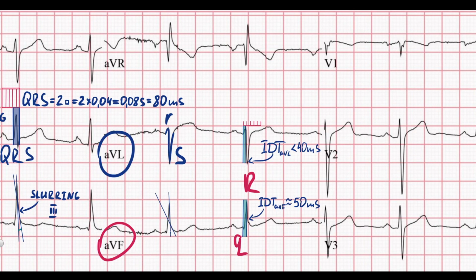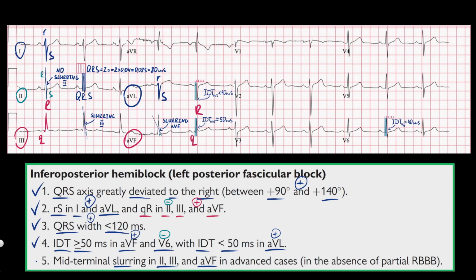The same we see in AVF, that confirms the left posterior fascicular block with some limitations that are connected to the second standard lead and intrinsicoid deflection time in V6.